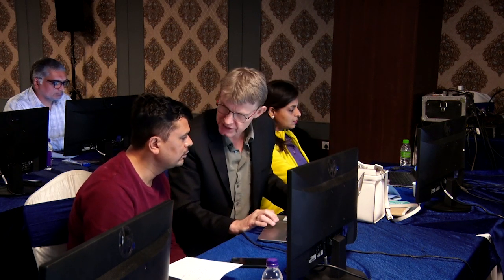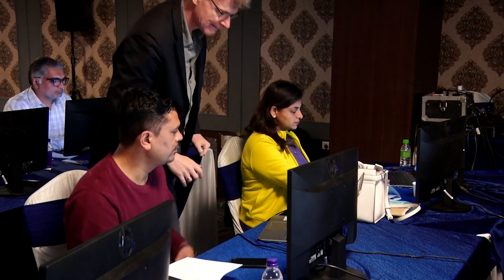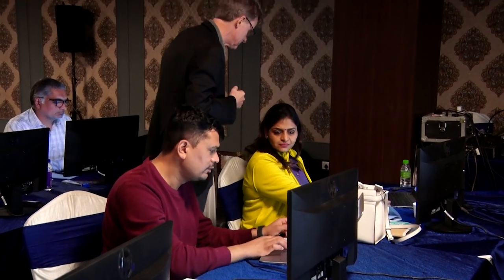And then it makes these strange things. There was one I was talking about. It does this, which I don't know why it does. These two signs. And now I would be surprised if it doesn't. It does. Then the important thing is you put in something there, a username, and then the password. Any name and the password.